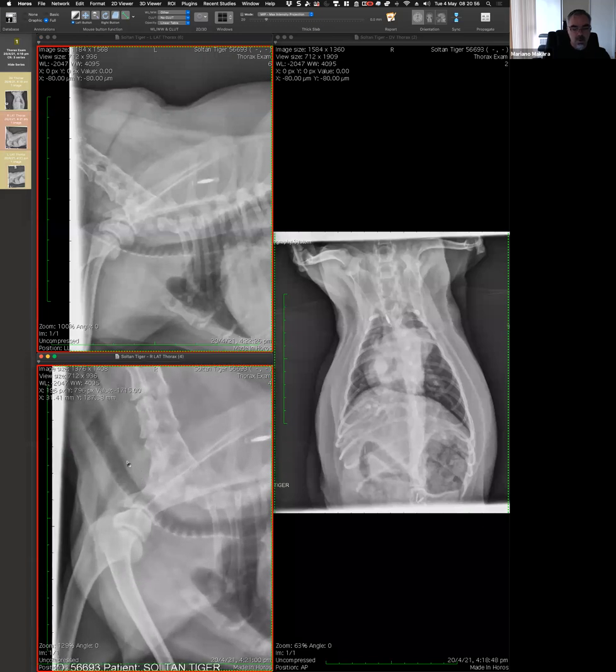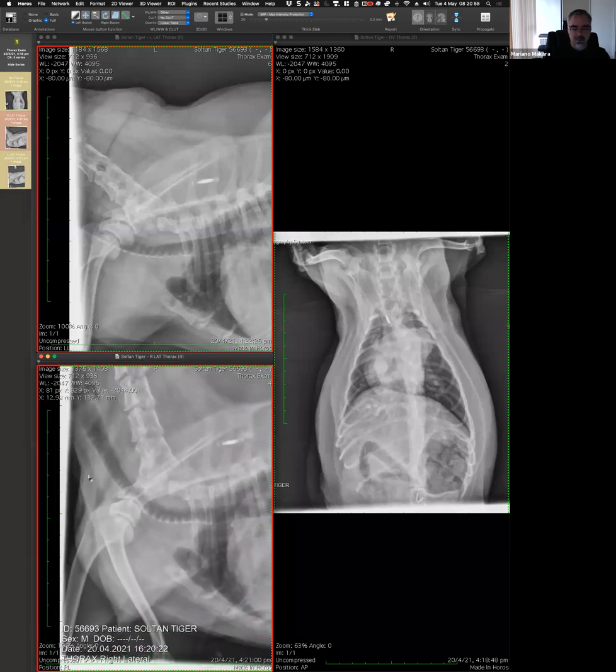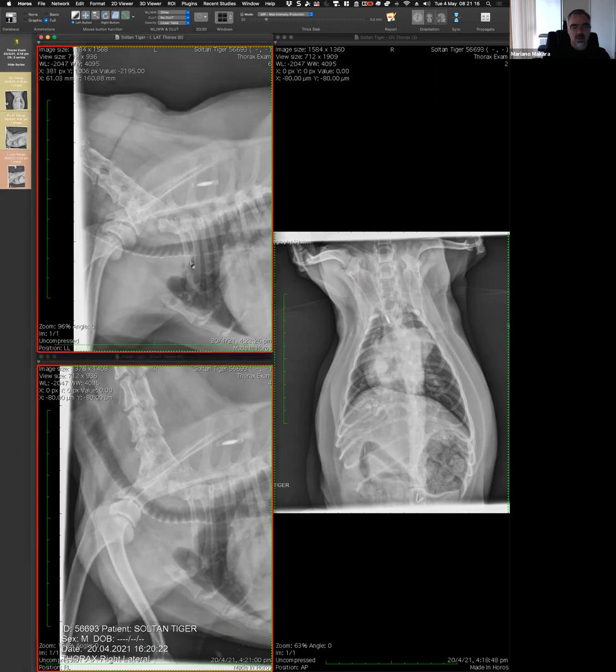So the way that we read this, and I think it works 90% of the time, is that there's usually this anatomical thing in the trachea dorsally, which is a membrane, and we allow that membrane to move a bit, as long as we can see the other border. There seems to be another line there.